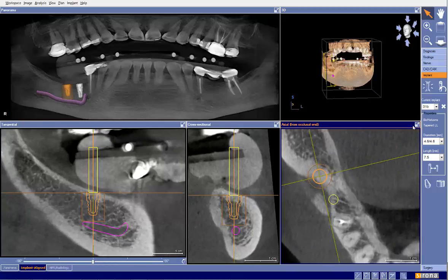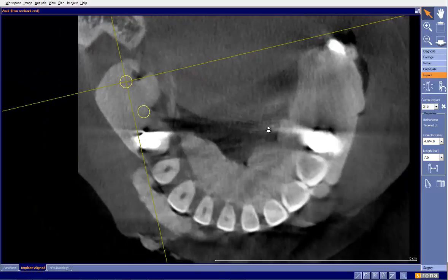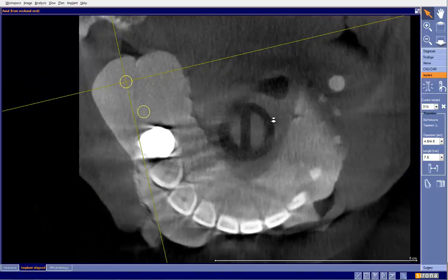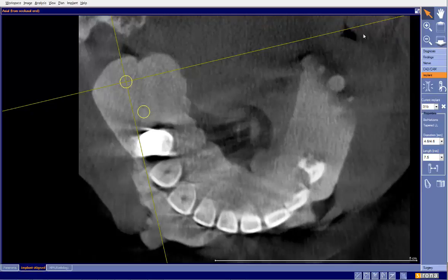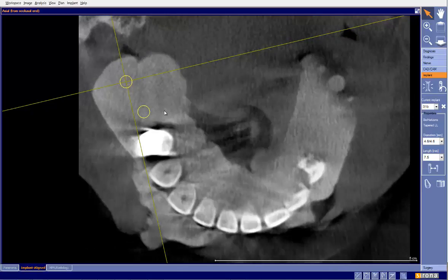I'm going to back up for a second and take you through what I would be doing if this were my case without the benefit of CEREC data. One of the things we can see in this view is the arch form pretty well. We see these lines that represent the insertion axis of the implant. What I like to do, and typically I do this mentally, but for this particular case I'm going to draw it out for us, is draw out my arch form.